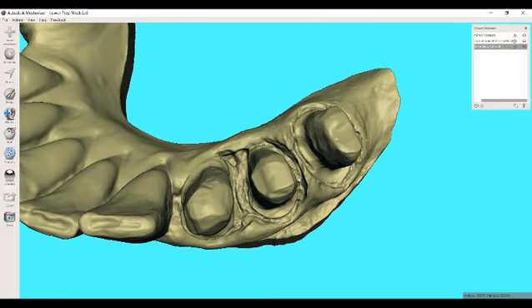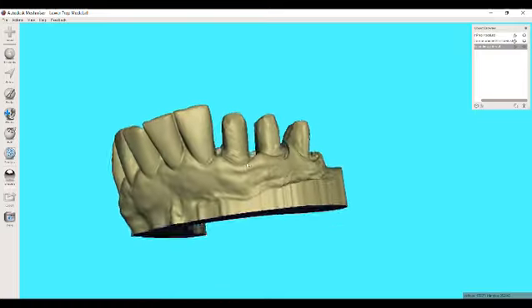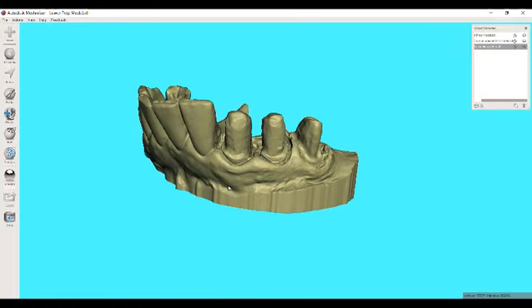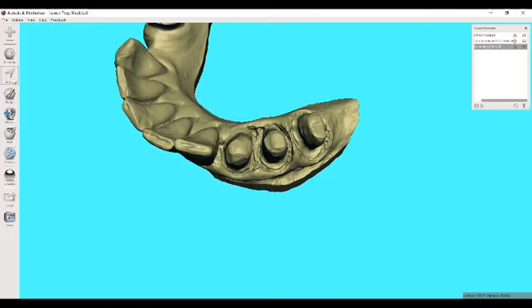And so if you wanted to have a printed model for a digital workflow that you could actually test your restorations on and maybe run them through an articulator, then you're probably going to want to ditch those models unless you want to sit there and do it by hand with a handpiece. So this to me is just an easier option. So we'll just do the lower model for an example, and then I'll actually show you too how I would mount this up digitally for the Glen articulator that I've designed.